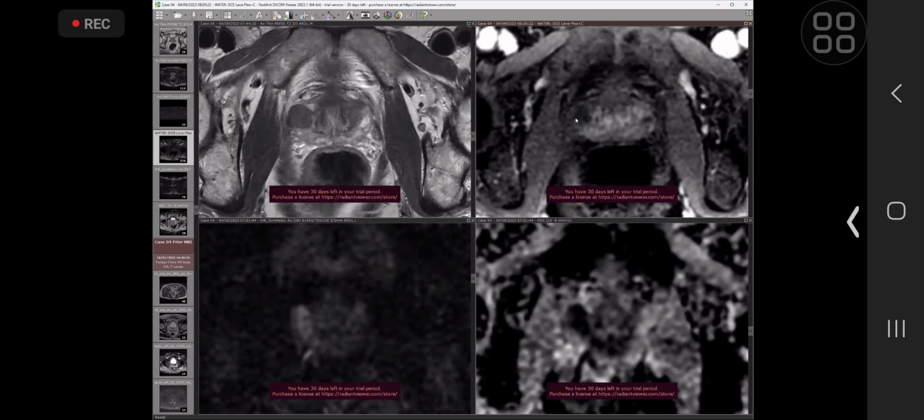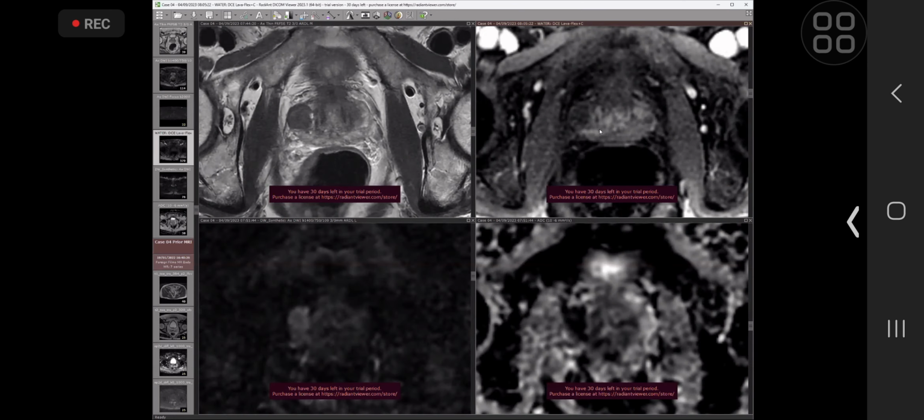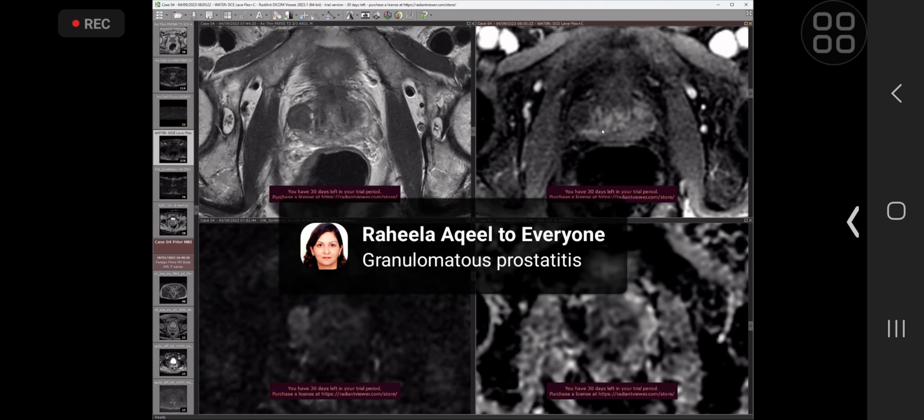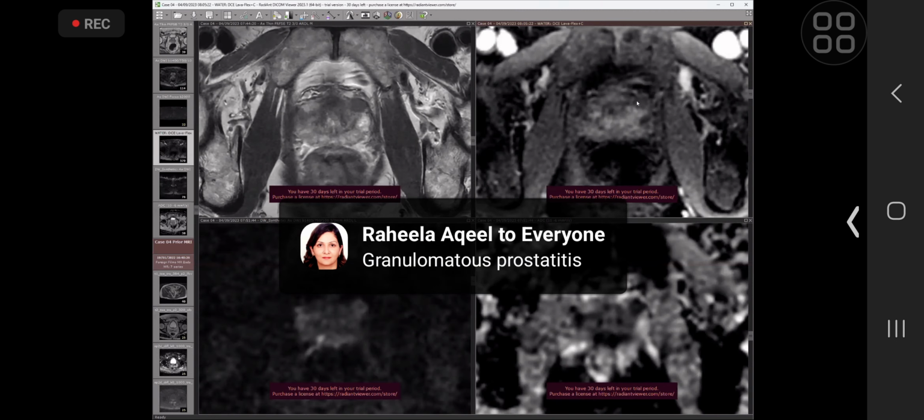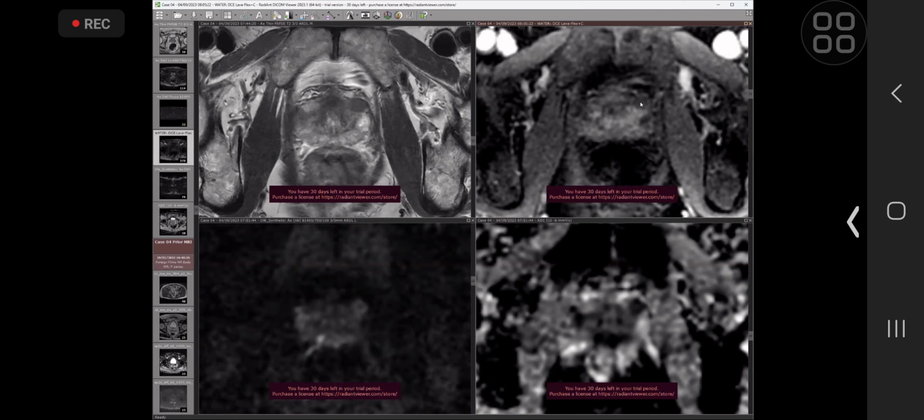actually there isn't enhancement within this area, but there is some enhancement around the area. And if we go again to this area more anterior, there doesn't obviously seem to be enhancement within the abnormality there, but perhaps there is some enhancement around it. Now, I mentioned that history of previous bladder cancer, which could be very relevant.